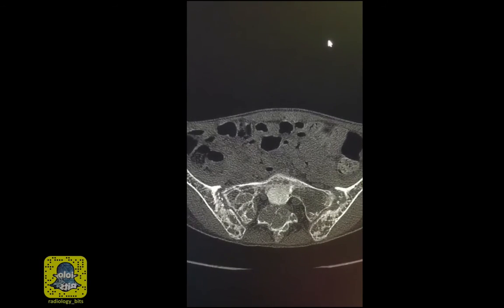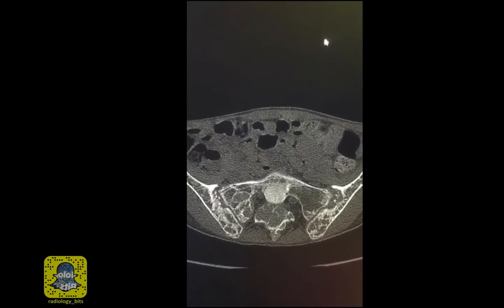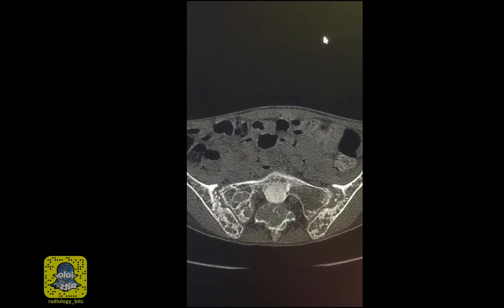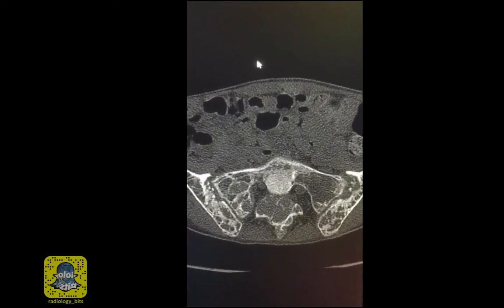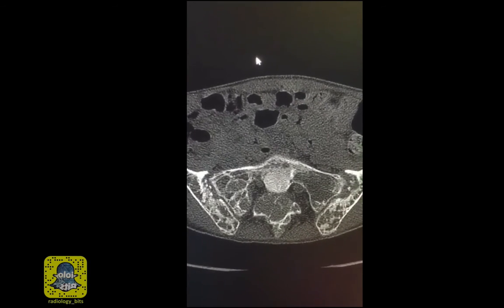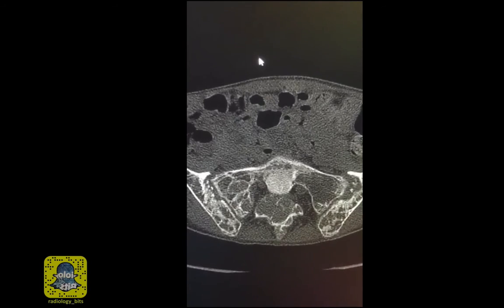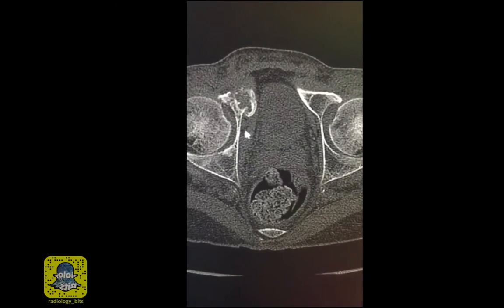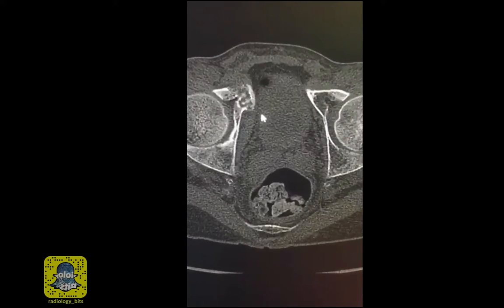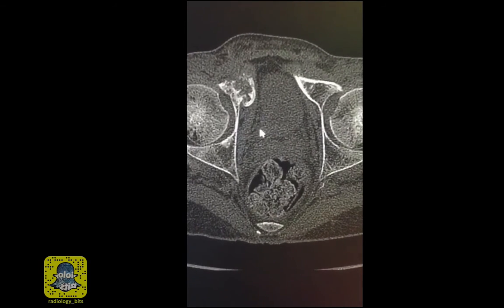So let's summarize what we talked about today. When you have expansile lytic lesions of the bone, there are a few possibilities. The classic three signs of Paget's would be bone expansion, coarse trabeculation, and cortical thickening, which we don't see here. Fracture with the abnormal underlying bone is called pathologic, and if you see callus formation, it's not acute.